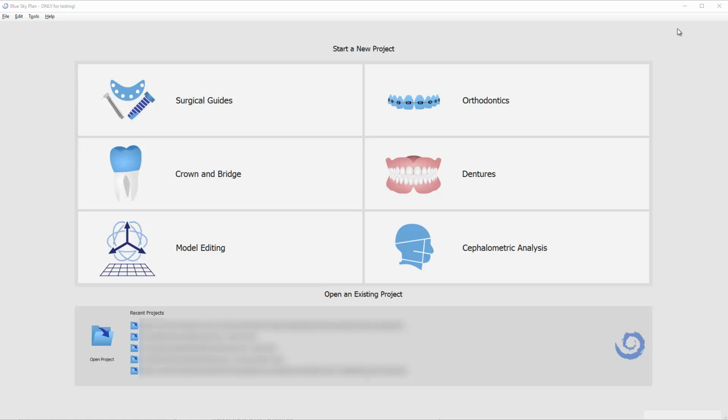In this video, I'm going to walk you through the surgical guide module, but using the wizard workflow. That is intended for really basic cases, especially for beginners to the software, placing 1 to 2 implants typically, and typically not going to be immediate implants. You can use it for that, but it takes a couple extra little steps. So really we're focusing on a healed site, missing tooth, and you just want to walk through the software and kind of have it key you into the steps throughout the process.